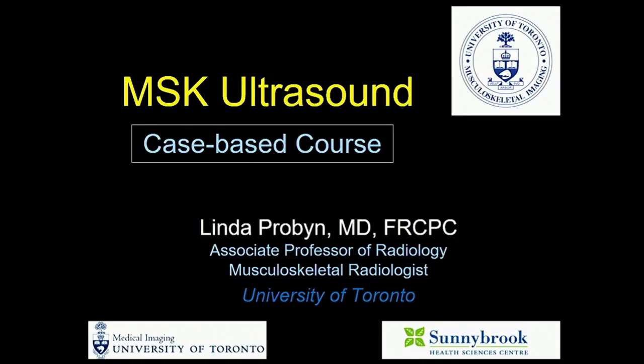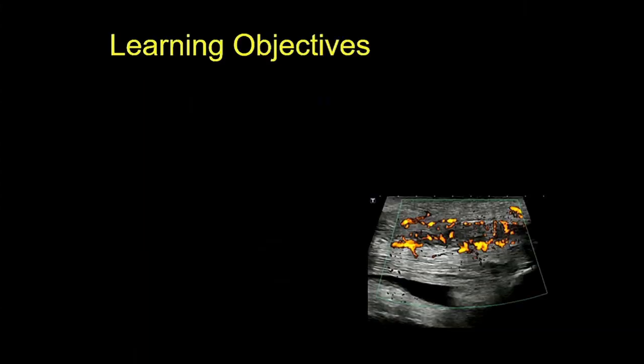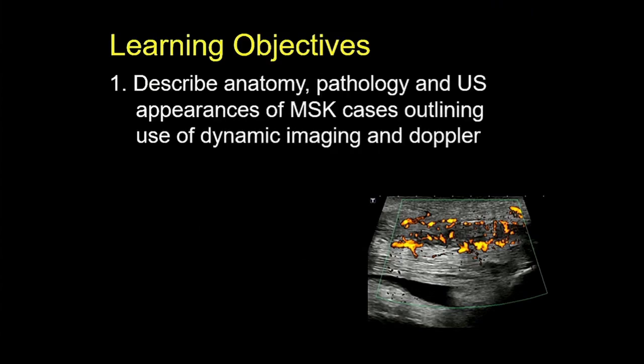Okay, thank you very much. So we're now going to be focusing on MSK ultrasound, and we're going to go through a variety of cases.